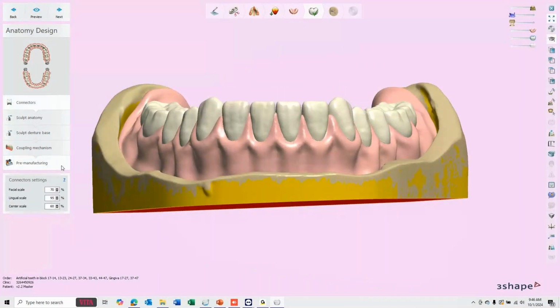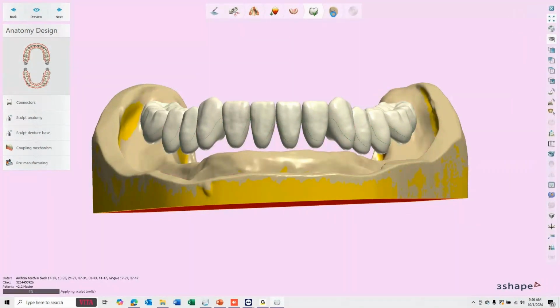All right, let's see if we can skip the lower here. Come on. All right, this is taking too long. While it's thinking, let's go do some other stuff. And then if it finally pops up, we'll switch back.